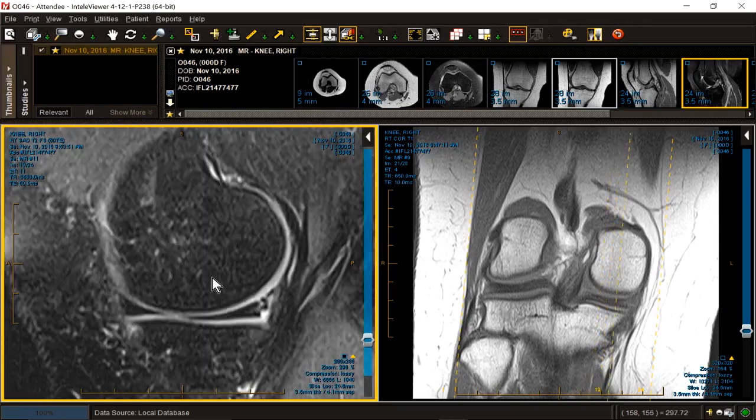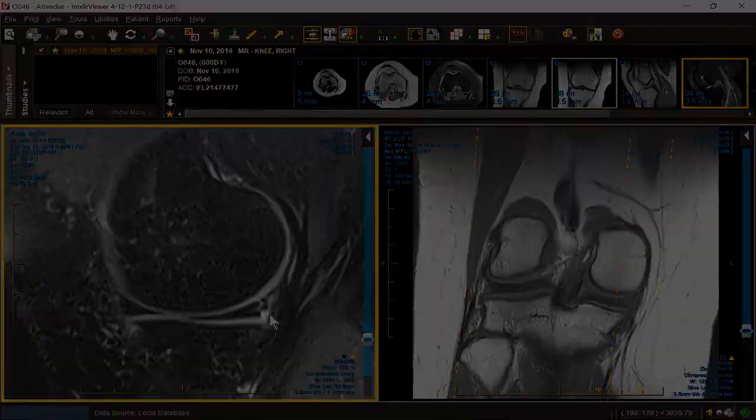So why do we get these tears in the back? Because we have this. The tibia goes forward, the femur goes back, and they impact and twist. So you put pressure down on the outer third of the posterior menisci. So it is common to see slits or tears in the meniscocapsular reflection. As long as there's not globular swelling and displacement like you saw earlier, no worries, it'll heal. So we might call that a meniscocapsular sprain.